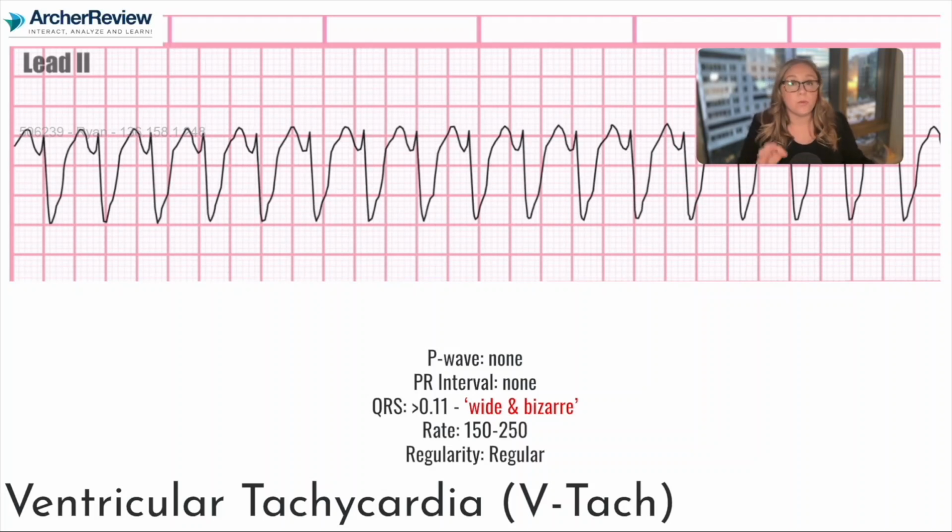It is wide and bizarre. This is ventricular tachycardia. We have a high rate. We do see that it's regular. What's happening here is that the ventricles are just contracting, trying to get some cardiac output out to the body, but it's in this really wide and bizarre pattern. It's kind of a futile attempt to perfuse this client.